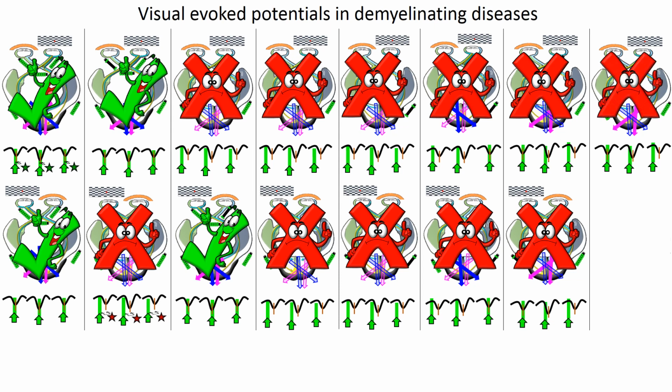Thus the right eye VEP is abnormal. Now I am introducing the same pathology, but the eye being tested is the left. Here also the delayed occipital stimulation will be on the opposite side of the stimulus. Notice that the transparent magenta vector being generated arises from the right occipital lobe.